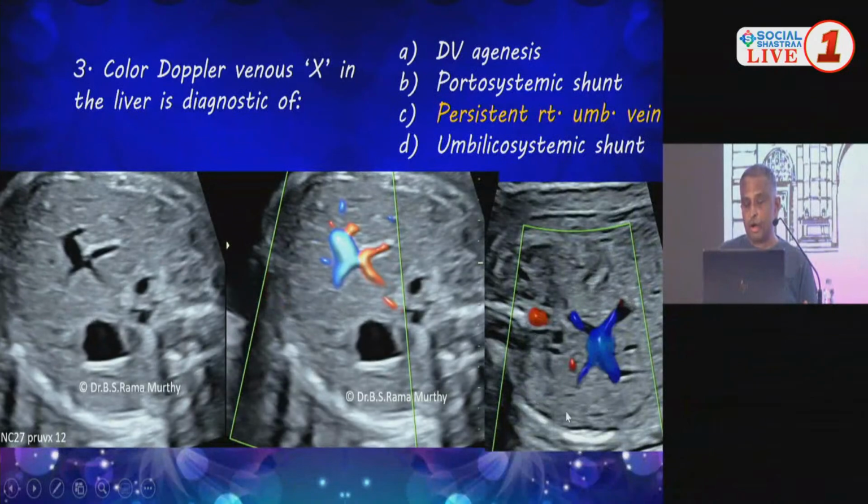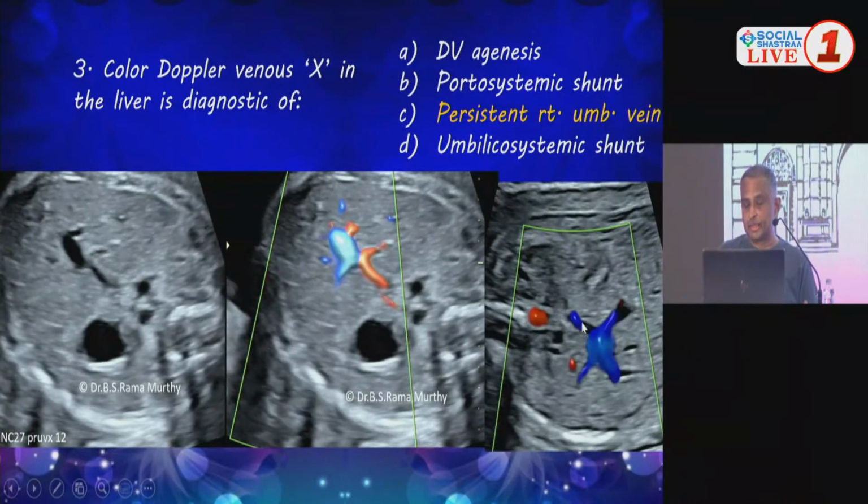We've got C scoring 39, correct? 39% have scored C. C is the right answer. And why is it right? I've got the normal X here, and normal X colors the same way.